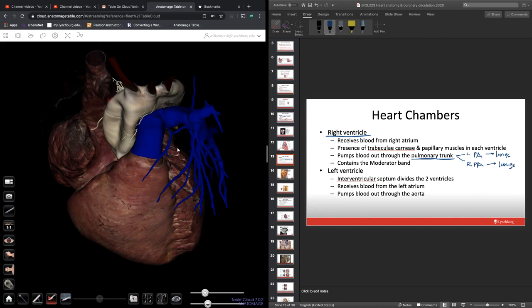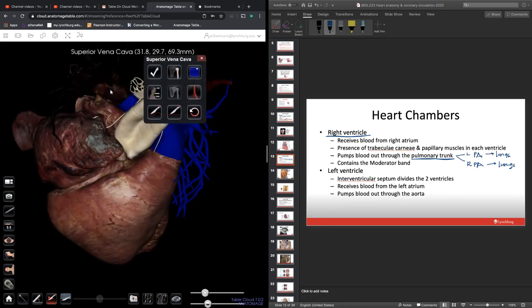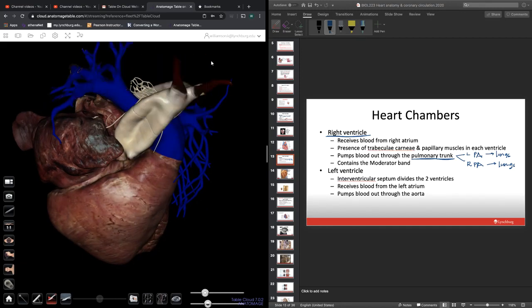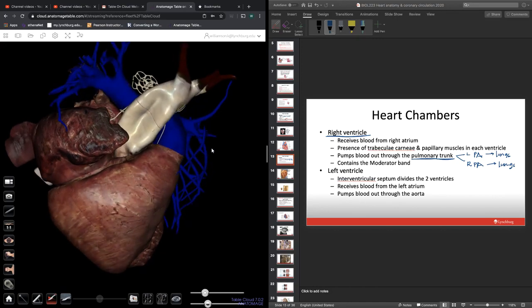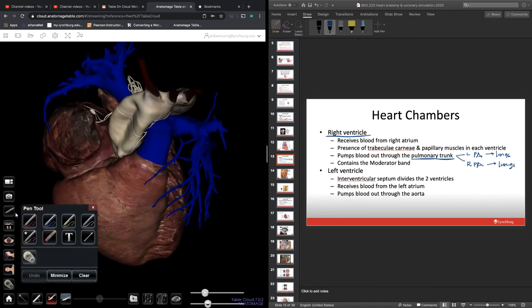And then that pulmonary trunk is actually going to bifurcate into our left pulmonary artery that's going to send blood to the left lung. And we can actually kind of twist around a little bit here. I'm going to flat color all of these structures blue because they're carrying deoxygenated blood to the lungs. And so you can see at this point how we've got pulmonary trunk traveling up and then a bifurcation. And we're heading to left lung, and then on this side we're coming behind the aorta and we're heading to the right lung. Okay, so that's going to be that bifurcation of the pulmonary trunk.